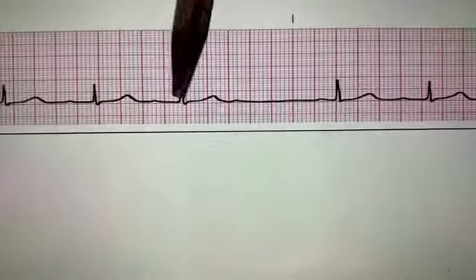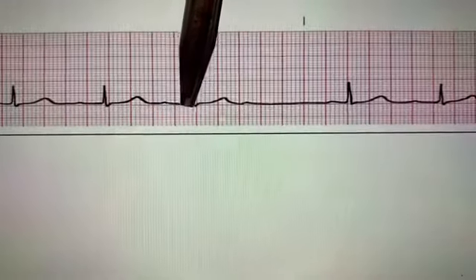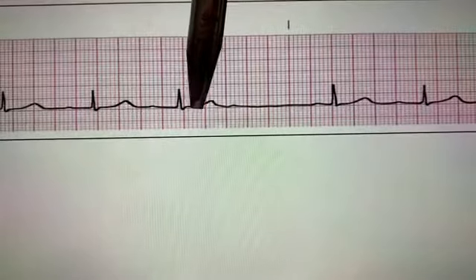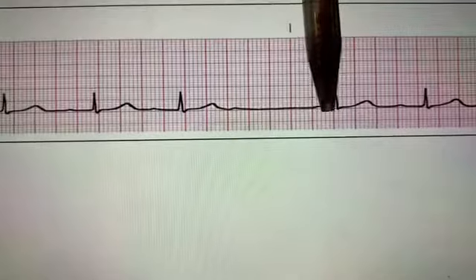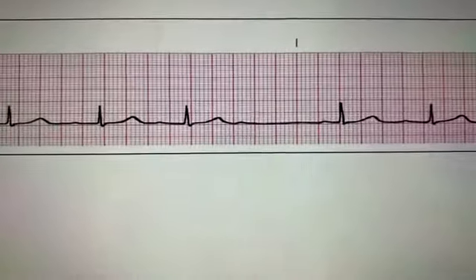So as you'll see here, there's a P wave, but see how that interval is so much longer, and then the QRS is just so small. And then there's your T wave, P wave, and look at that interval, it's just crazy. And there you go, small QRS, and so on.